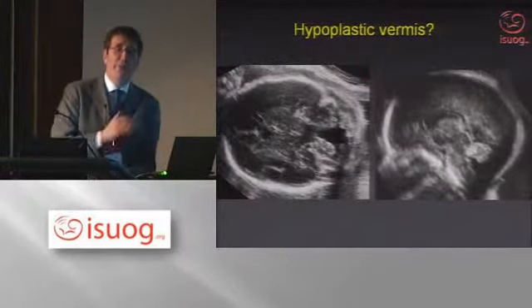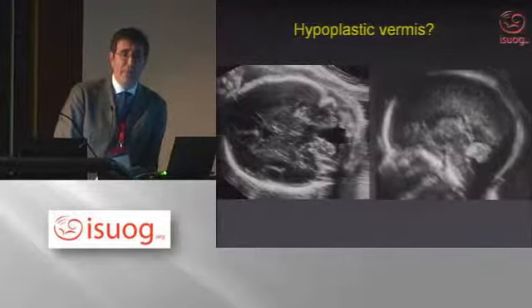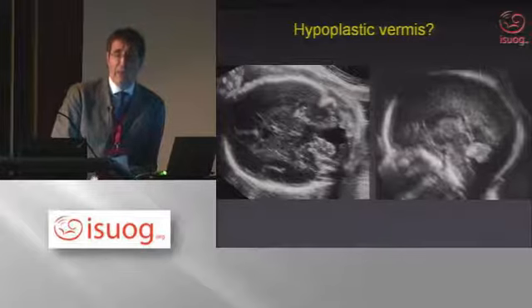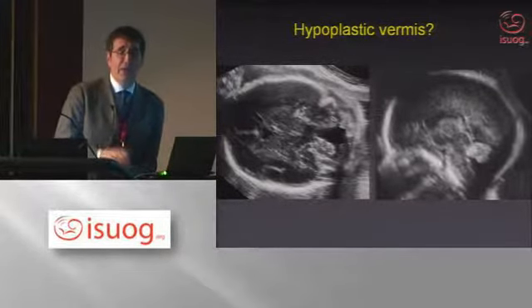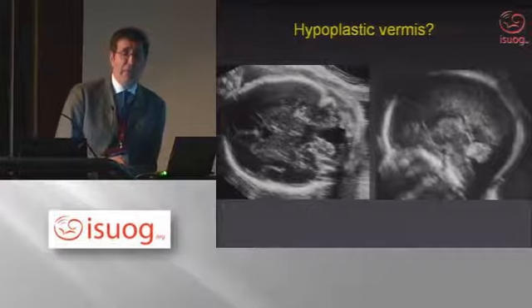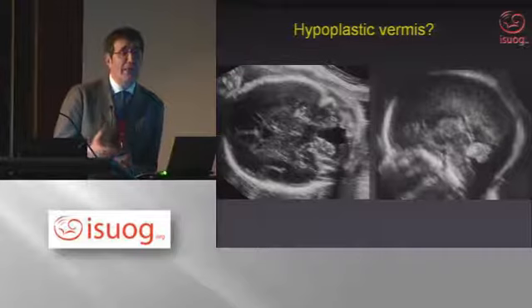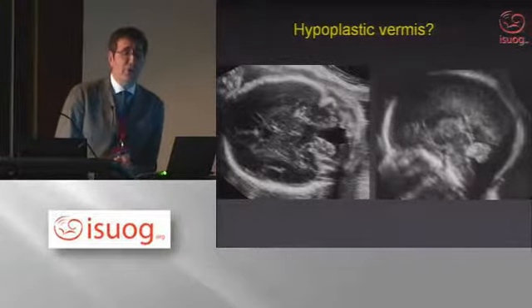Now, I'm going to show you the previous image. Does it tell you anything? Well, in fact, it is V-shaped, which is the finding that carries the worst prognostic connotation. So we now include this in our algorithm. It is very important. If there is an hourglass configuration of the communication, usually that is a very good prognostic sign.